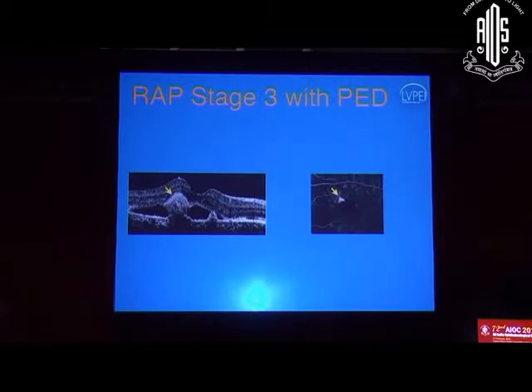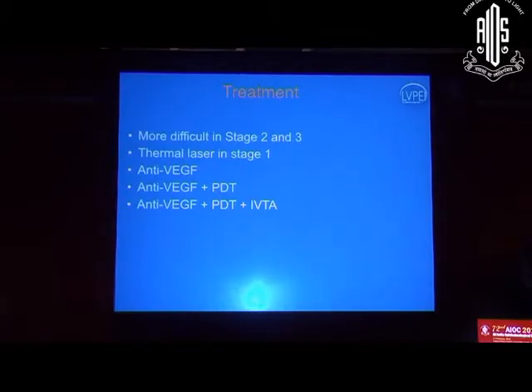So that's something which you need to do. If you do an OCT elsewhere, you might see only the subretinal and sub-RPE lesions. But you have to look at all the OCT scans and find the scan passing through this bright spot. You might be able to pick that up and identify it. The reason you need to identify this is that the prognosis for these patients is not that great when compared to regular CNVM in AMD.